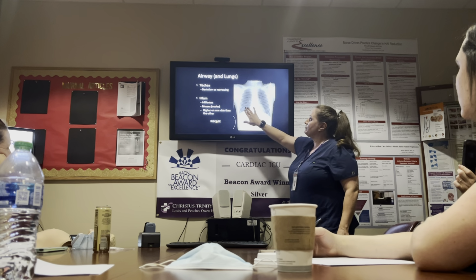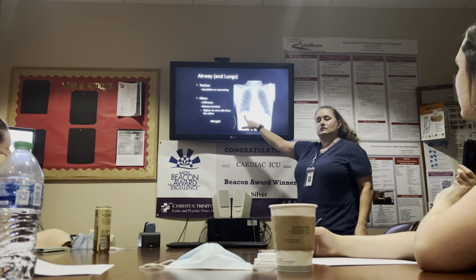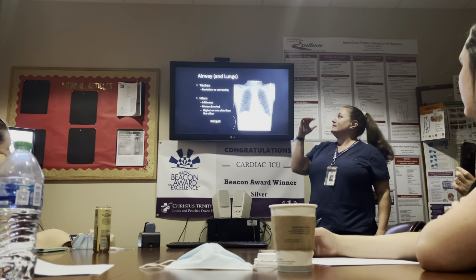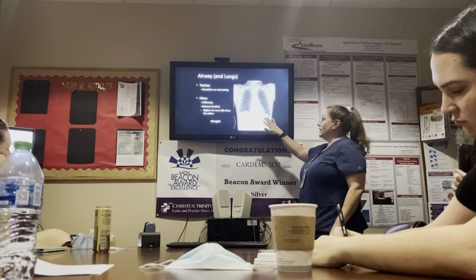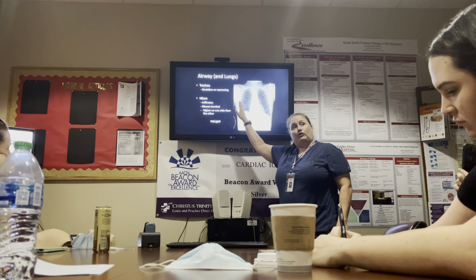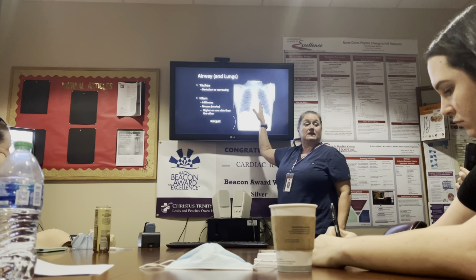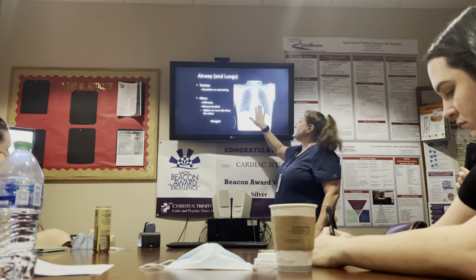You want to look for any infiltrates, nodes, masses, and if it's higher on one side than the other. What's under here on the right side? The liver. The gallbladder is over there too, but the liver is the thing that pushes the right diaphragm up higher than the left diaphragm. And it's surprising because you have 3 full lobes of lung on the right side. You have 2.5 lobes on the left side, the upper lobe, the lingula, and the lower lobe, because you have to make an accommodation for the cardiac positioning in the chest.